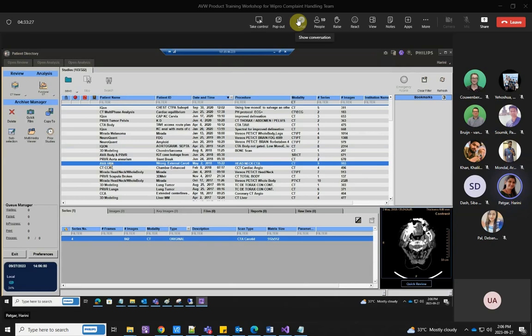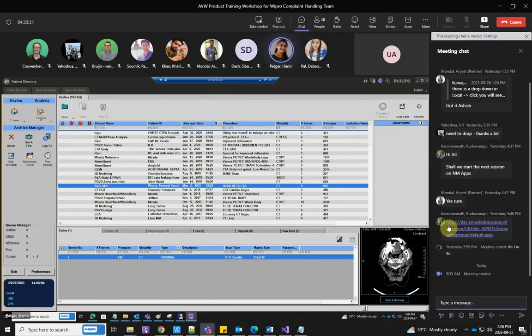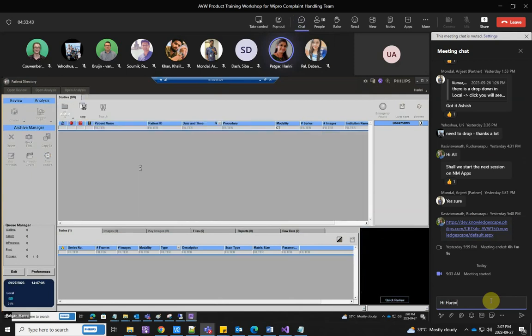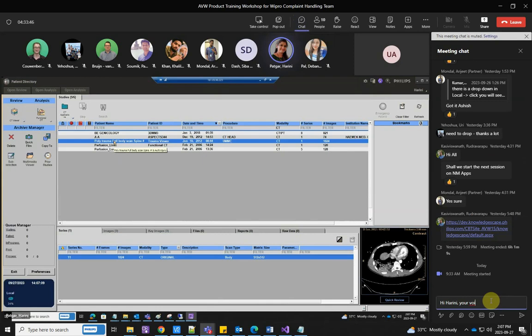Head and neck, AVA head and neck, we have head scans. And you can see in the quick review here, it is a head scan and something like body separate, vessels analysis of a body. Head and whole body also it supports. I have a study in the CT applications kept here. See, full body also we can load.